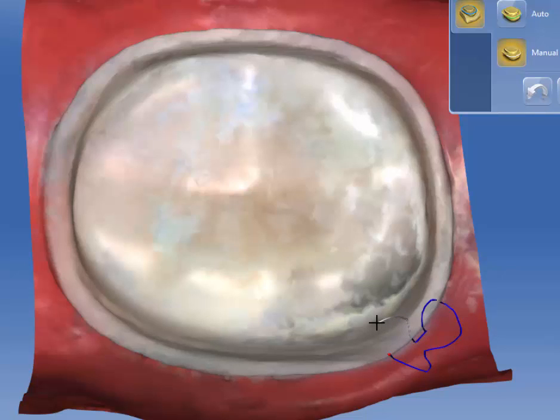If you have made a click and you want to go backwards, you don't have to undo it. You can right single click, and when I right single click, it goes back to my last single click point. So I'm going to right click, right click, right click, and I'm going back to where this was. I could also obviously go up and hit undo, or I could hit reset. Undo does the same thing. It goes back one step, just like a single right click.